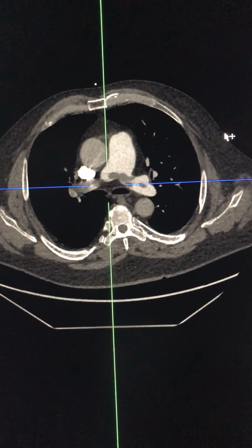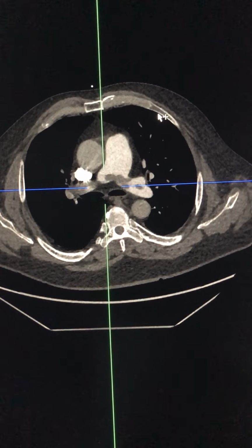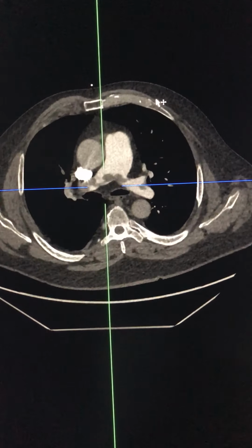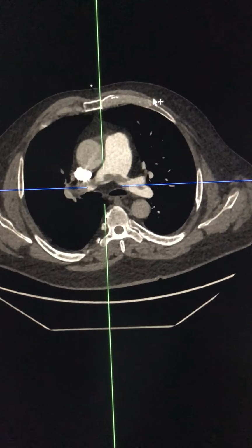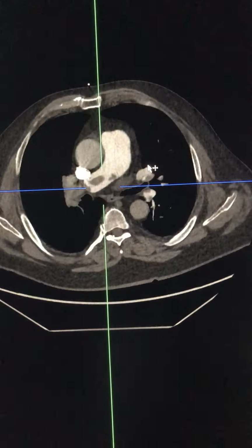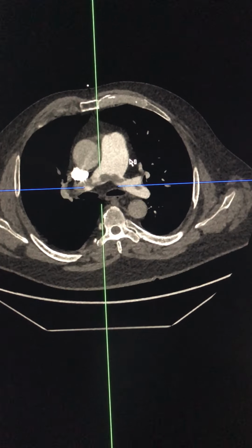In this video, we're going to look at some of the features we use to determine when there is right heart strain in a patient with pulmonary emboli. One of the features is the actual embolic burden, especially in this situation where there's a saddle embolic component and multiple occlusive emboli in the main pulmonary vessels. The embolic burden is very high, and that results in back pressure in the pulmonary artery and the pulmonary trunk.